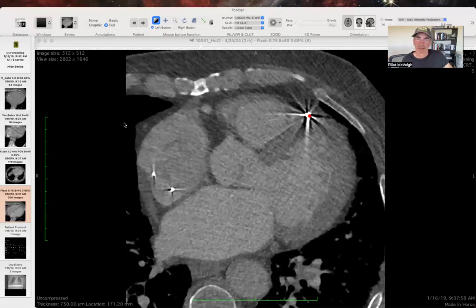Okay, this recording is to describe the process by which we're going to identify and record the locations of the pacing leads in the AUH patients. There are usually 2 electrodes on the right lead and 4 electrodes on the left lead. So we need to identify those, and we need to put them in the cardiac coordinates so that when we do the analysis and show a bullseye plot, we know where the leads are on that bullseye plot.